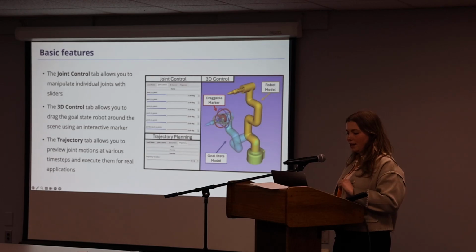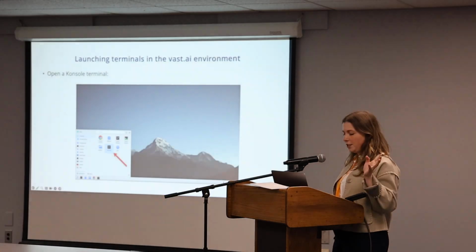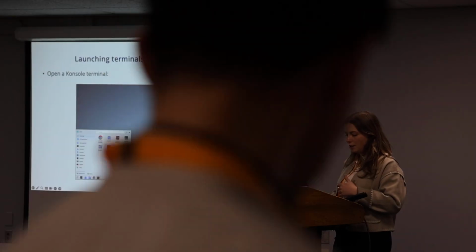So if you want to go into the container, we can start with the actual follow-along session. And the first thing you're going to do is launch a clean console. You might want to close whatever you have open now, and then just launch a console tab. I'm going to try to do this.